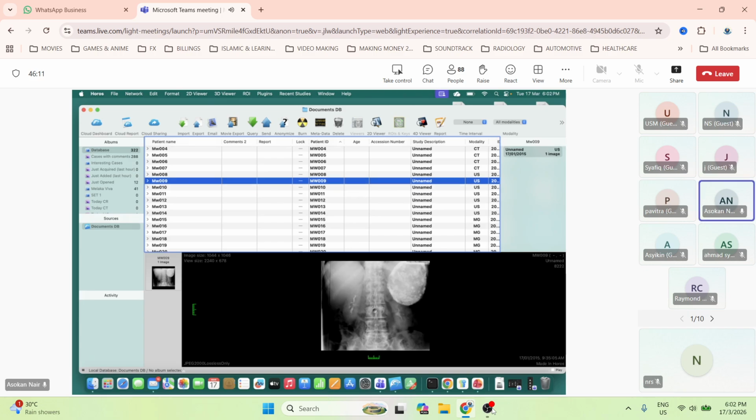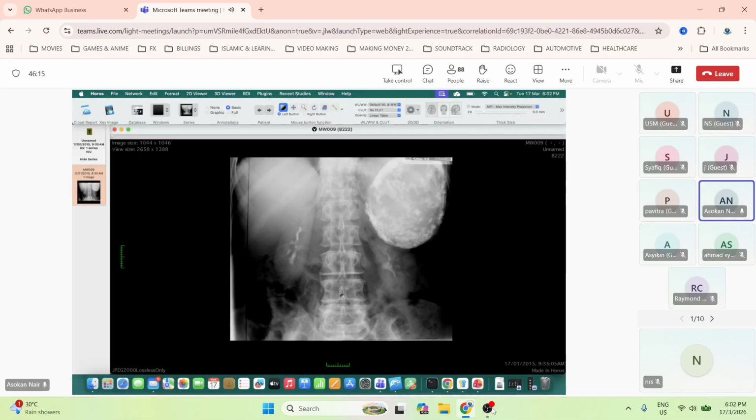Okay, this one, again I doubt you'll be shown this or you'll ever know, but just as an interesting case, that's a large mass in the spleen, cystic with a thick calcified wall and multiple small calcifications swimming inside.